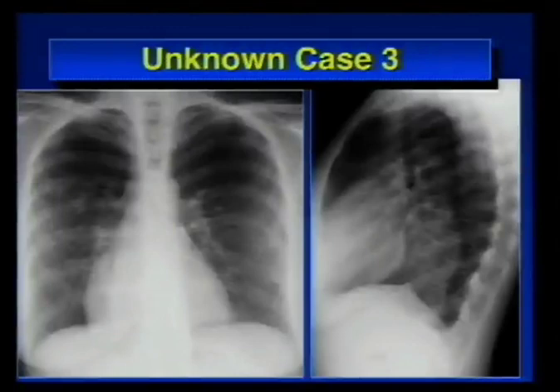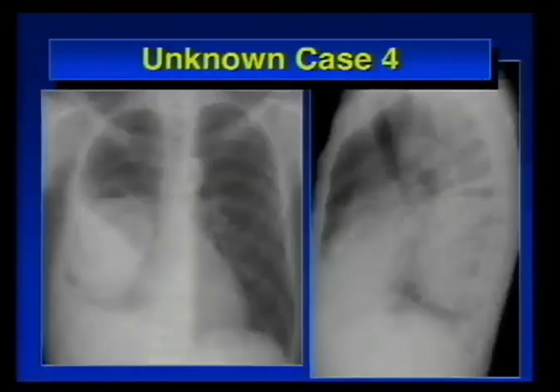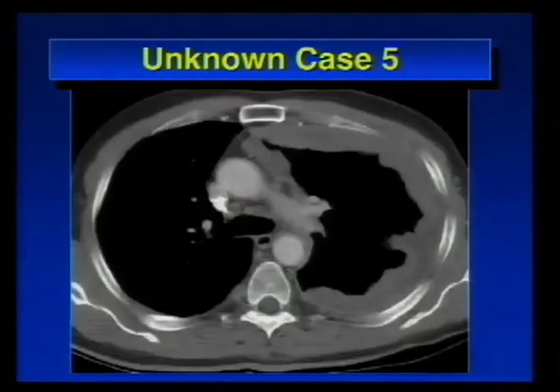That's pretty interesting, isn't it? Okay, case 4. Try to come up with 1 or 2 possibilities. And case 5.